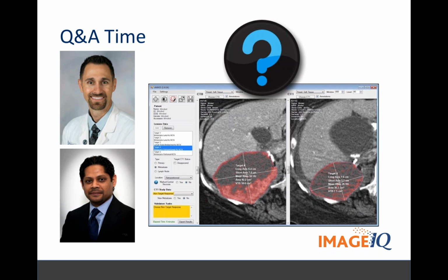So I can see where that would be important for a number of different tumors and situations in clinical trials, and I think we could do that. It's amenable. Since everything is embedded in the software and outputs as you're doing the measurements, you're not really waiting for anybody to re-enter that data into another EDC, right? It's happening live as you're making those measurements.